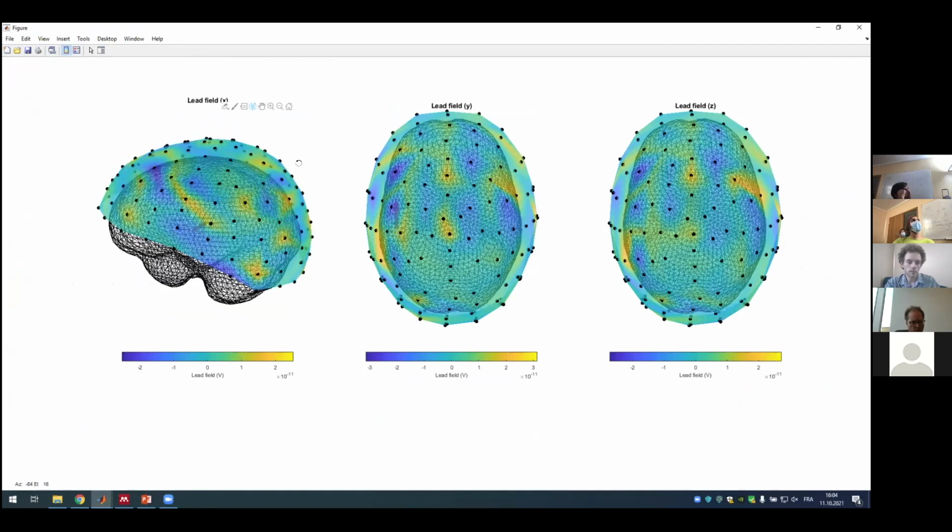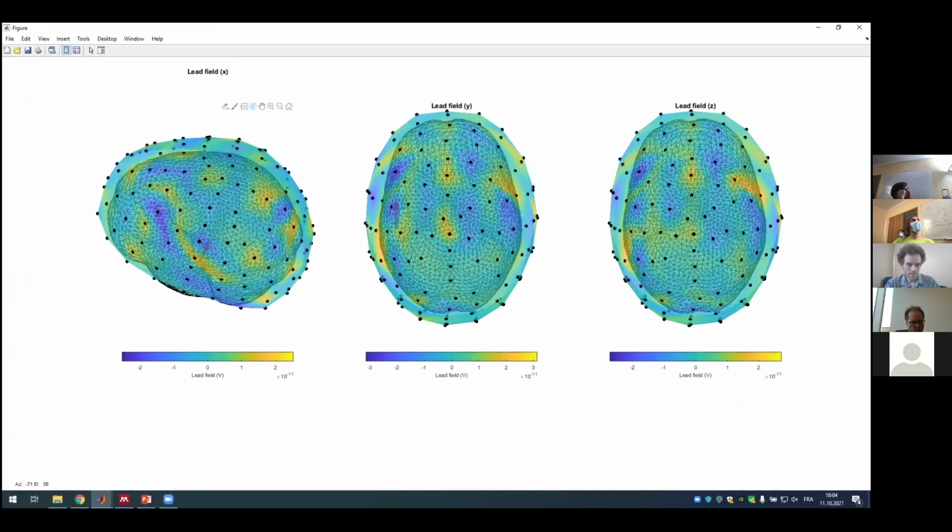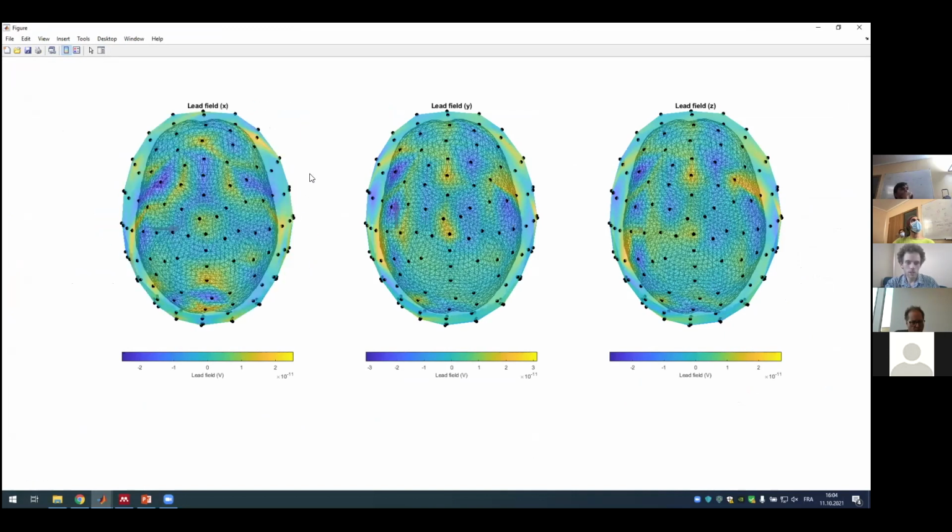Here, it's completely wrong; it didn't manage to compute a proper lead field. It could happen on a normal MRI, because, as I said, you have holes in the mesh, something is cut, or you don't have enough space between the layers, and it's a bit difficult to solve.